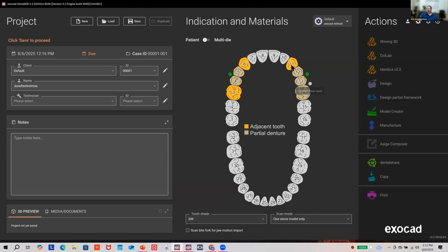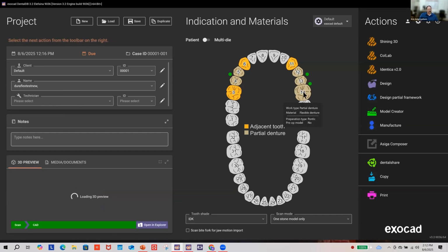And so if the teeth are splinted together, that's going to make them all work together to stay put in that base. Because that's always a struggle with flexible partials, is the fact that you're dealing with a mechanical lock between the teeth and the base, not some sort of chemical adhesion. And so I like to splint those together. And then you'll move over here to go over to your design.